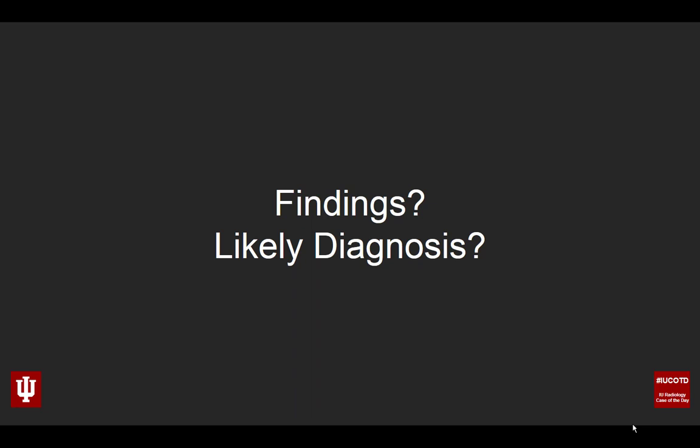Okay, so 2 questions this time. What are the findings? And what's the most likely diagnosis based upon those findings and the patient's age, for this incidental finding?